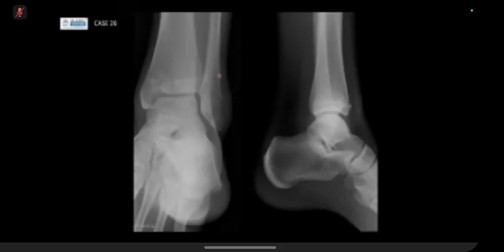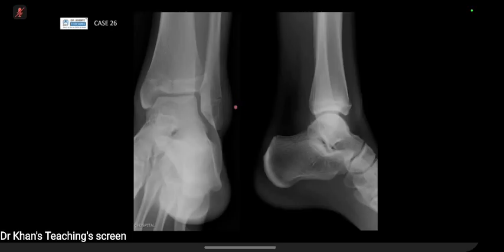So there is soft tissue swelling, okay. Certainly on the lateral aspect, maybe you can say a little bit on the medial, just because, to my eye, they look a little bit more full compared to normal fat. But there's definitely more on the lateral side than the medial side. So I usually make an eyeball, subjective measurement. So this is quite small and this is big. So you say more on the lateral side.